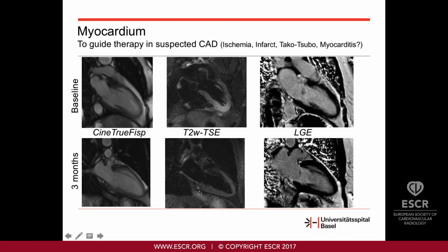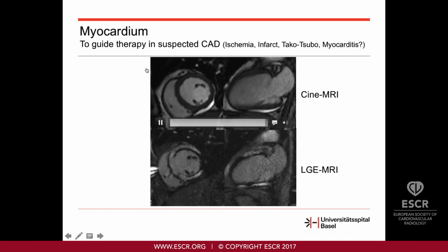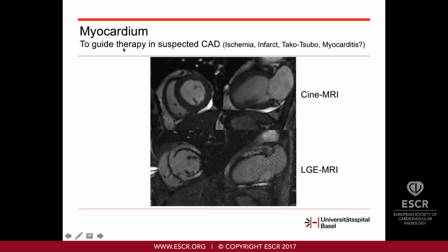And please note the distribution of this late enhancement. It's subepicardial in location, so the subendocardium is spared, which indicates this is not myocardial infarction.